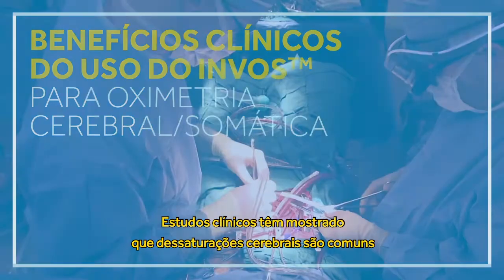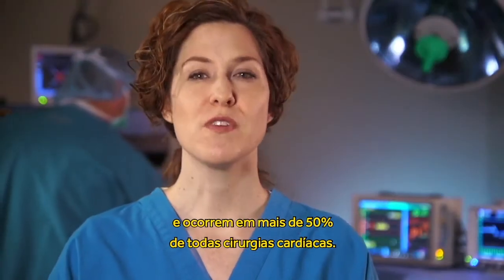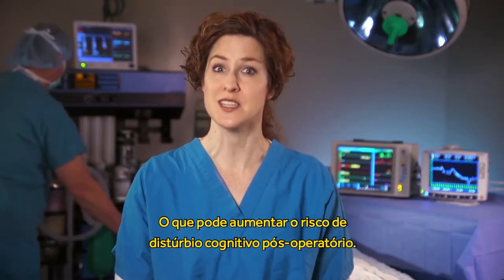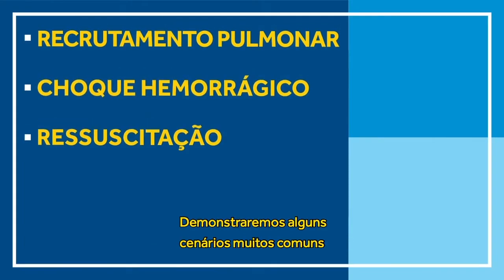Clinical studies have shown that cerebral desaturations are common, and in fact occur in more than 50% of all cardiac surgical cases, which may increase the risk of post-operative cognitive dysfunction. In this INVOS demonstration, we will show several common clinical scenarios that can lead to cerebral desaturation.